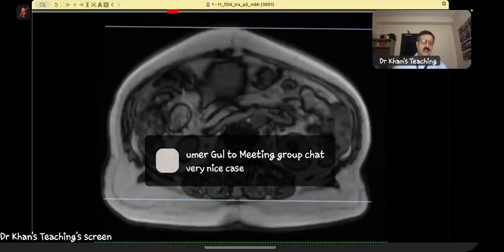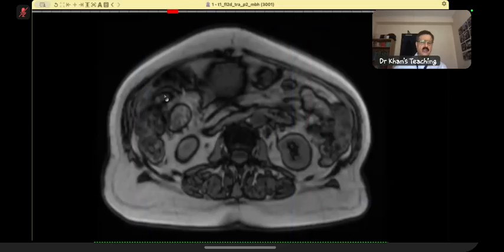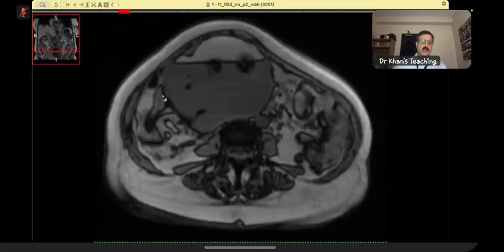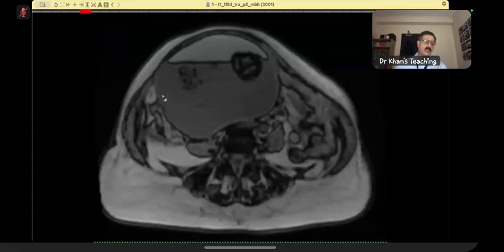She picked up multiple features and some other features. Let me take you through that. Terminology-wise, these days the word dermoid is technically not used; instead of dermoid, you should use the term mature teratoma. And this is an immature teratoma. In this age group, it is very rare, but this is what happened.